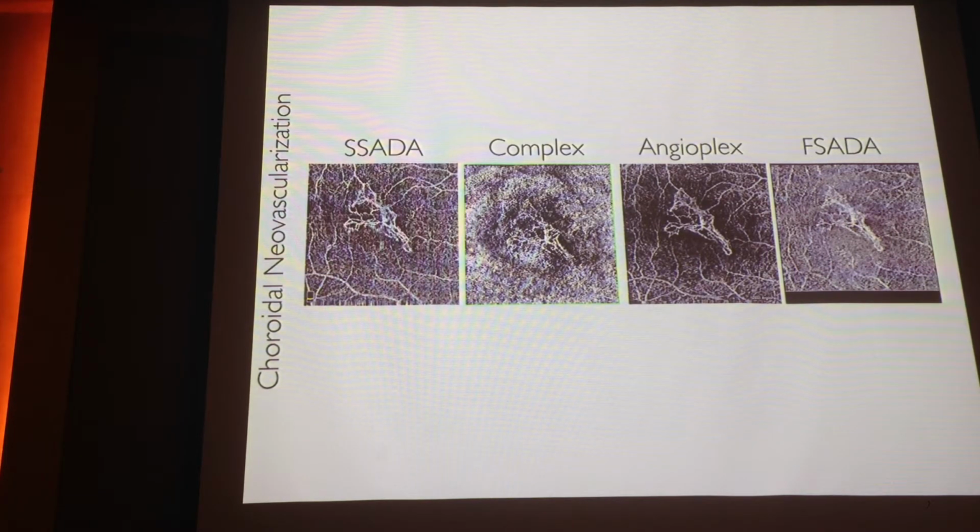You can get more details. But as I showed you before, one of the advantages of the angio OCTs is that you have high contrast, and if you start to add too many details, particularly in choroidal neovascularization, probably you have less contrast, and it's more difficult to interpret the images, but not a normal, a kind of nice angio.